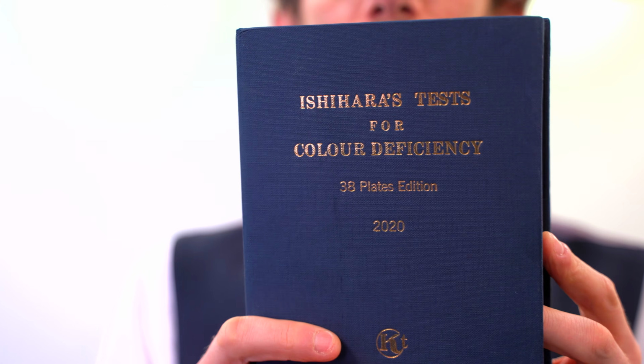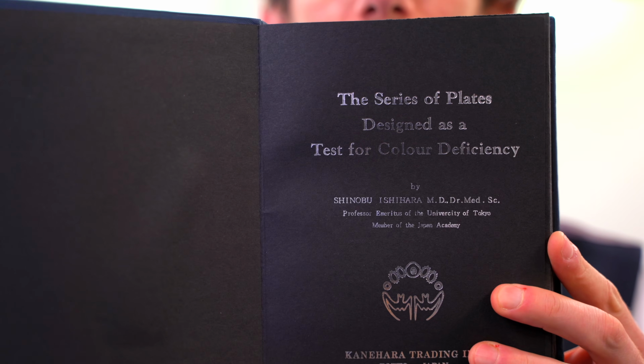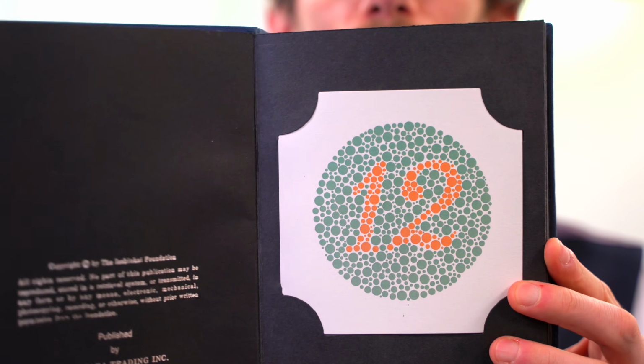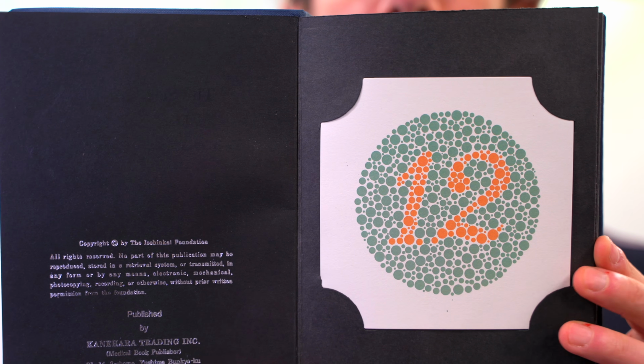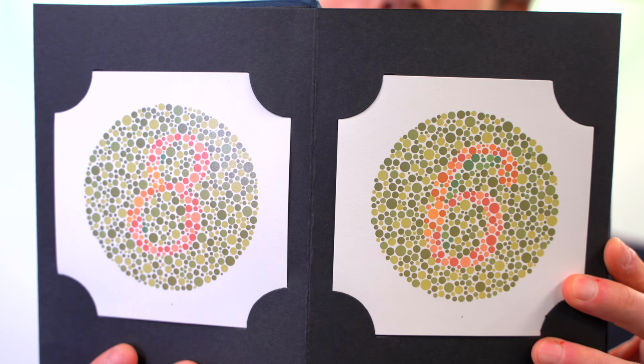When our phone is in night mode, the colours don't look right, and similarly, the Ishihara charts wouldn't look right under that light either. So make sure where possible we're using a natural light. Also, we need to have the charts 75 centimetres away from the patient and held up across their field of vision, not placed flat on the table.